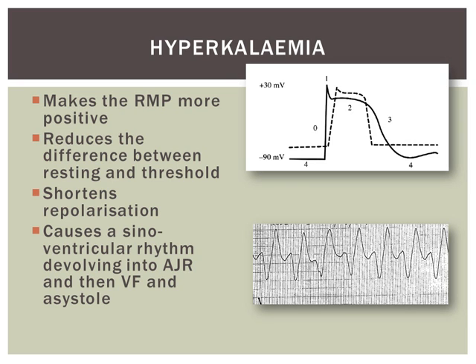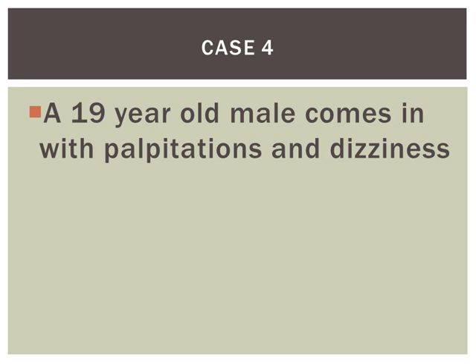The QRS complex spreads right out, and so it's common that it's thought that this rhythm from hyperkalemia is VT. Now, it's not VT. Remember, VT is a reciprocating tachycardia from the ventricle. This is a sinoventricular rhythm, and shocking the patient is not going to be successful. So you need to aggressively treat the potassium. All right, we'll move on to case 4.